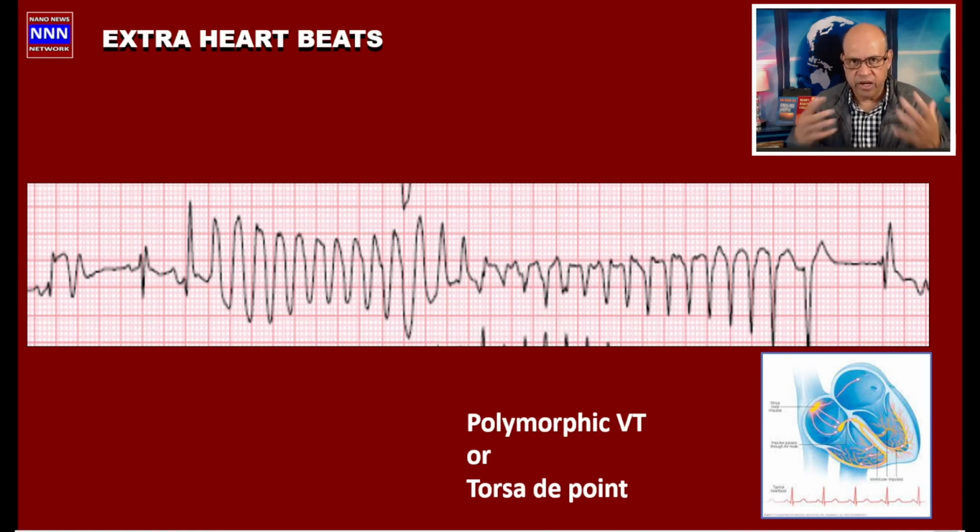Whenever you are looking at a patient with a rhythm like this, we know this is an extremely sick heart, and it can also be related to the drugs, the antiarrhythmic drugs they are getting, because some of the antiarrhythmic drugs are arrhythmogenic by themselves and can cause torsade.